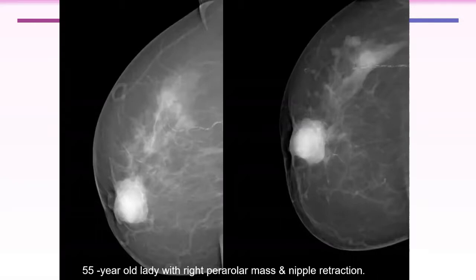What is your differential diagnosis? No distortion or calcification or diffuse skin thickening. So what could it be? Maybe multiple fibroadenomas. Fibroadenomas causing nipple retraction? No. Even if the pathology is fibroadenoma, you are not going to put it in your differential diagnosis because it is not typical. It doesn't behave like a fibroadenoma.